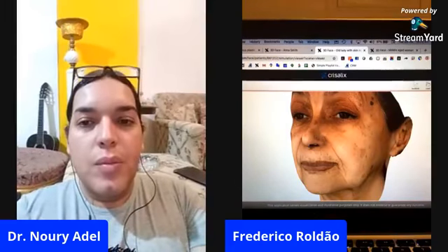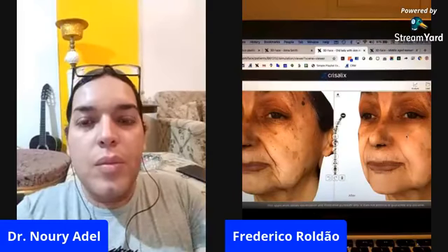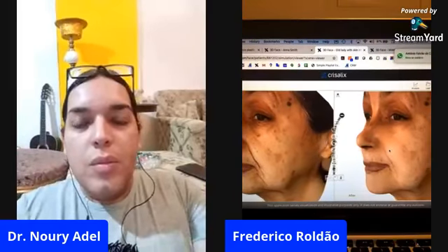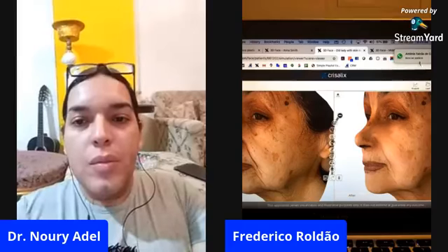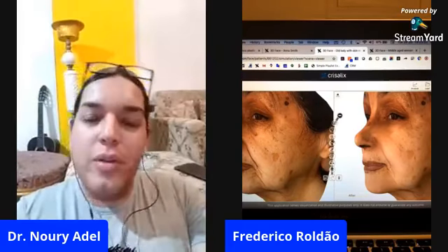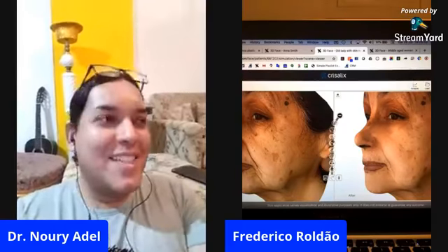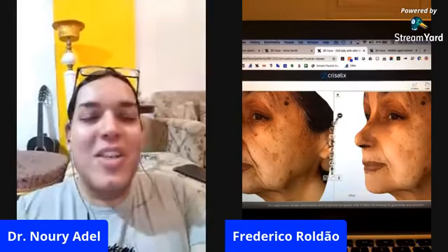Yeah, exactly. Let me show you something. We can see the before and after side by side like this. Yeah, this is better, and she looks natural. There's something that I wanted to tell you. Yes, sorry, go ahead. No, no, I wasn't asking, I was just listening.